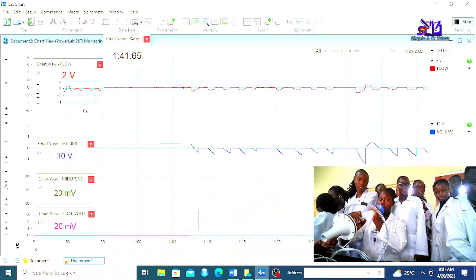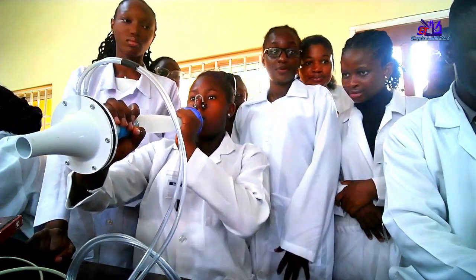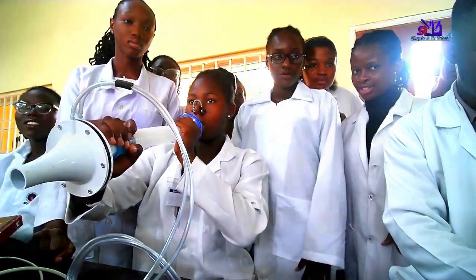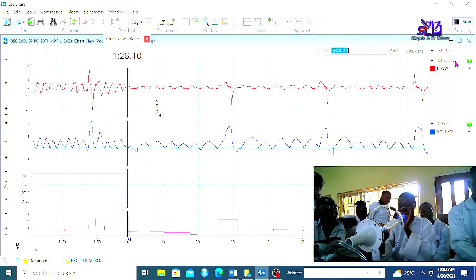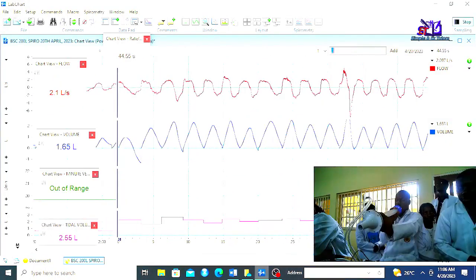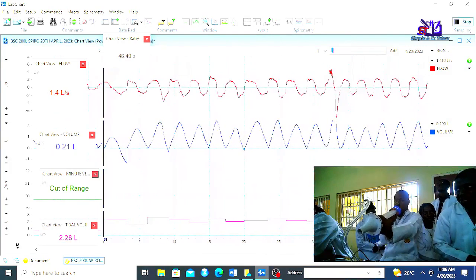Welcome everyone. Today's video is going to be an extension of our practical class from last week on spirometry, and of course is my first video. I am going to take you through several processes analyzing data on spirometry using PowerLab.